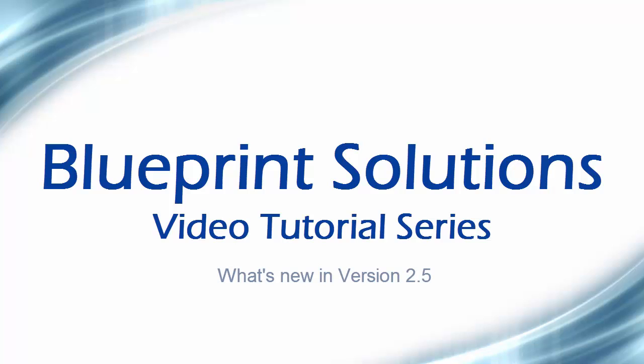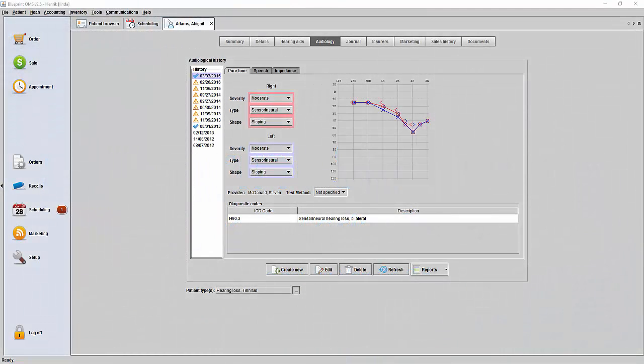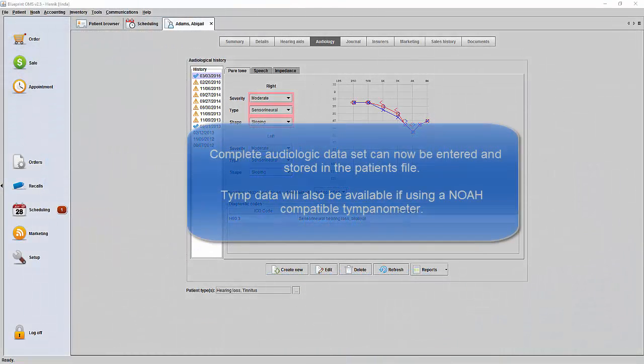OMS video tutorial series. In this tutorial, we will provide you with an overview of the main new features in version 2.5. The main new features in version 2.5 are a complete audiologic data set can now be entered and stored in the patient record, similar to the data stored in NOA.